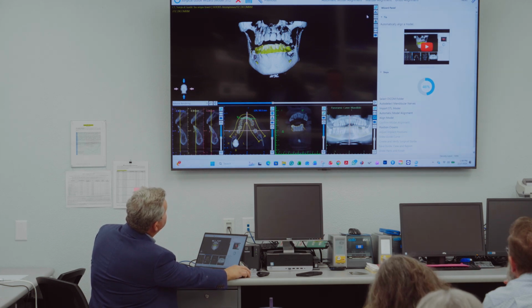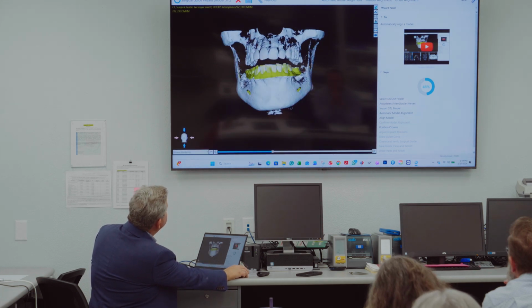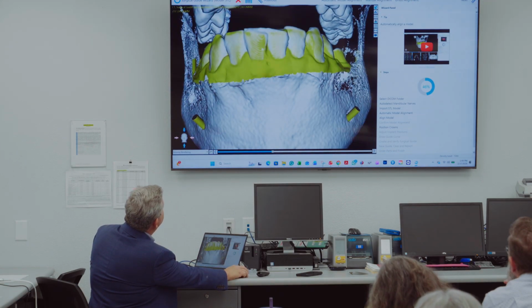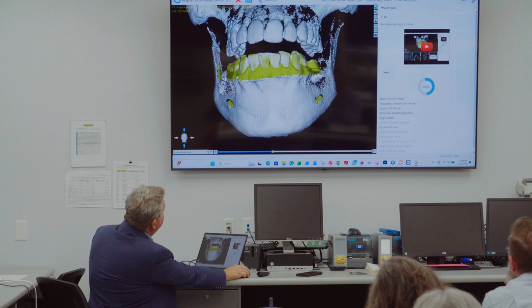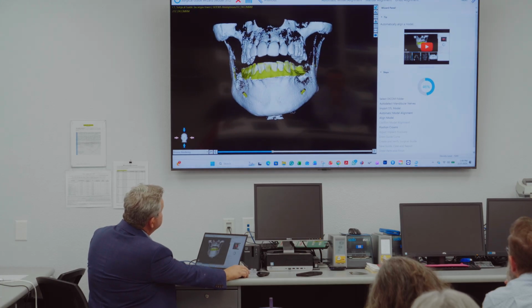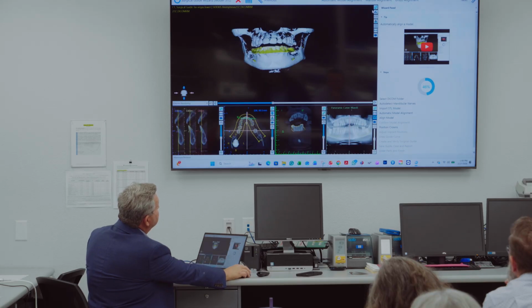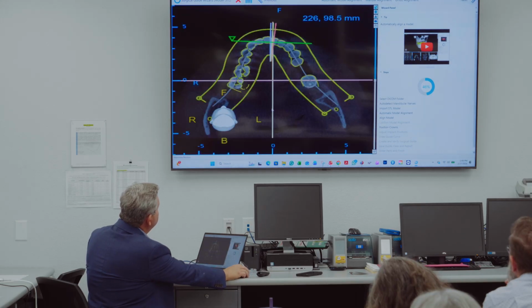Okay, what I like to look at, I'm going to blow this up some, is do you see how this is kind of speckled and kind of blended in, kind of multicolored? That's a sign of a good registration. It's called a color map. I mean, it's one way to look at it. And if you see a lot of that combined color, that kind of gradient looking, that means you've got a good registration.